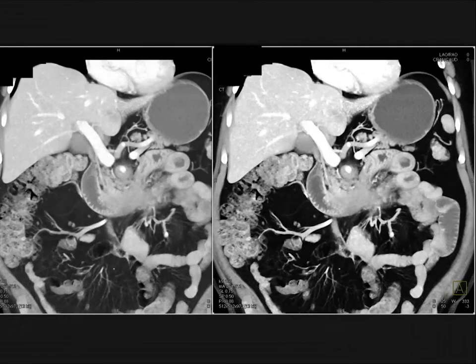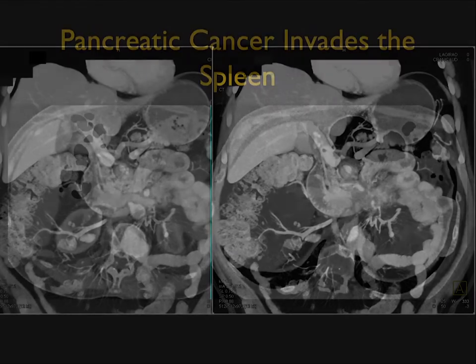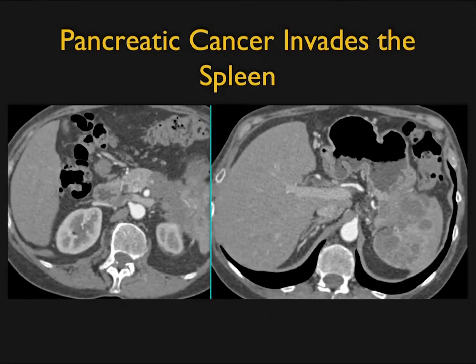And you can see a very problematic case for the patient. They may need to put a percutaneous tube in, either in the duodenum proximally or in jejunum, to help this patient with feeding, because this is really obstructed. These are the ones you worry about giving radiation therapy because of perforation. They'll typically do chemotherapy. Now, I mentioned direct invasion. Here's a good example.